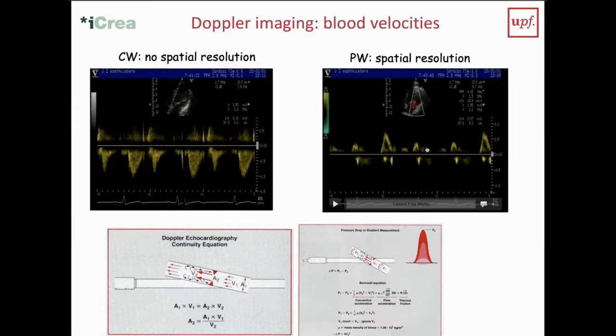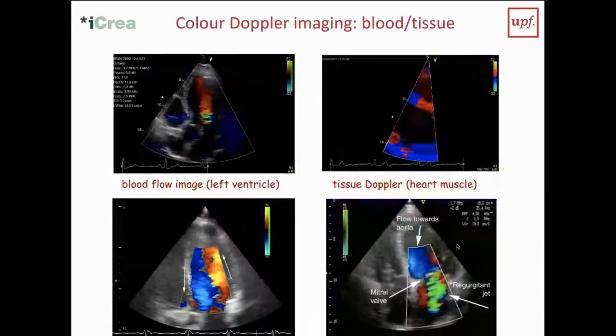Or also we can look at velocities here. For example, this is velocities through the mitral valve in order to see what's the relation between the amount of blood that comes in with what I said, this early elastic filling, versus the amount of blood that is being pushed in by the atrium. Because when you get a lot of fibrosis and you have very inefficient early filling, the atrium has to take over. And so by looking at the ratios of these, we can get information.